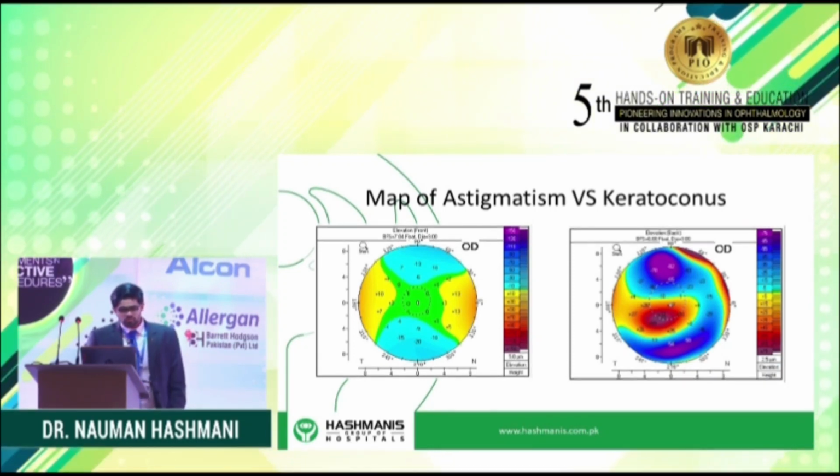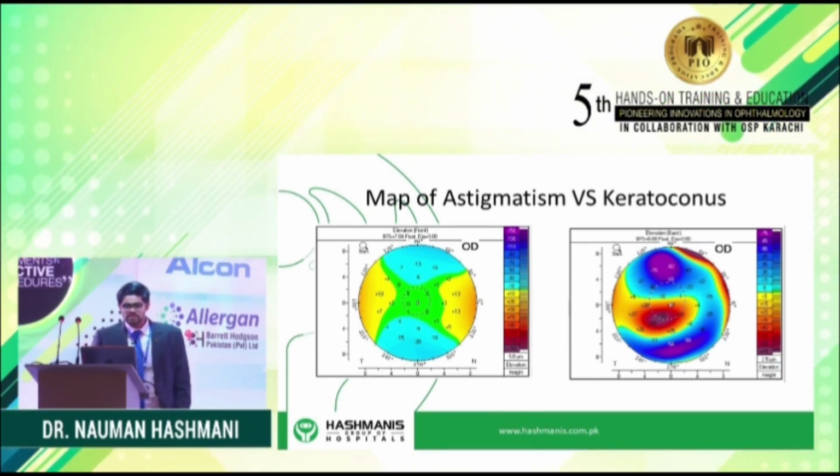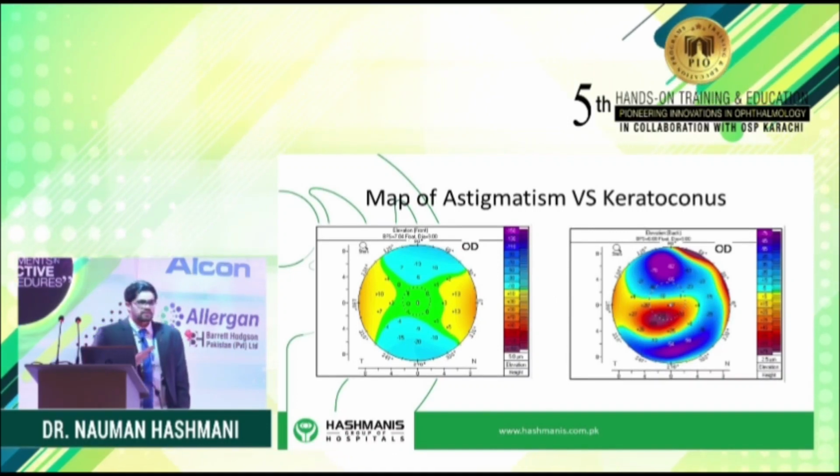Now, what a lot of people will do is they go to this thinnest location, plus 69, and say that this is why it is keratoconic. But you can identify the cone of the keratoconic cornea. If you see this red circle, this is a highly elevated area compared to the rest of the cornea. That's your keratoconic cone, and that's what I mean by a qualitative analysis.